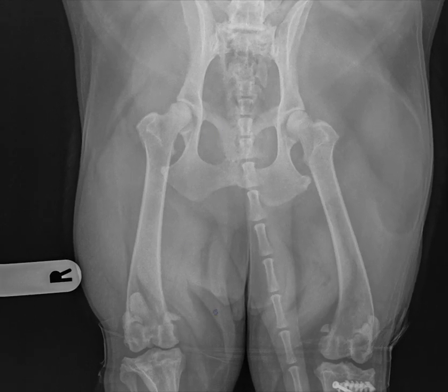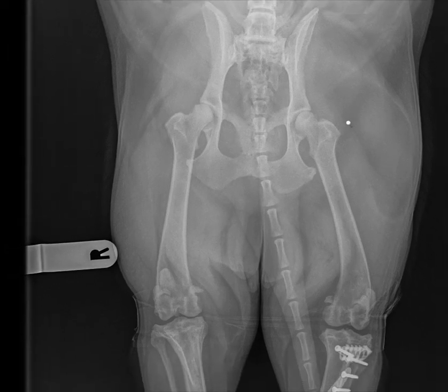One thing that it's important to remember when assessing orthopedic images is not only do we want to assess the osseous features, which is often the most interesting part, but we always want to take time to look at the soft tissues. I'm going to bring your attention to asymmetry of the soft tissue structures in this case. This may have also been noted clinically, although it does depend a little bit on the conformation of the dog and their overall body condition.